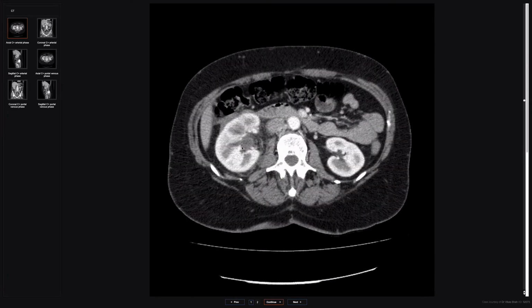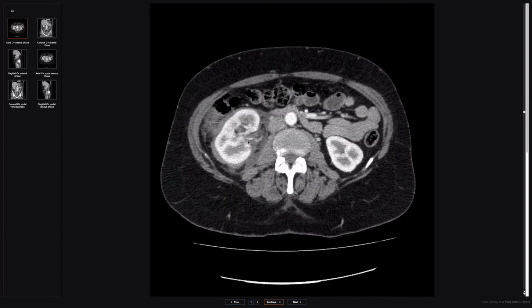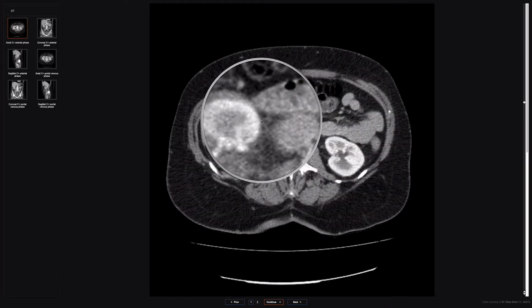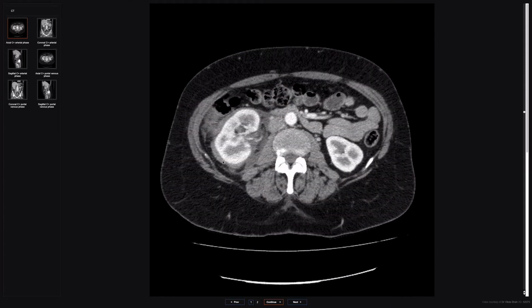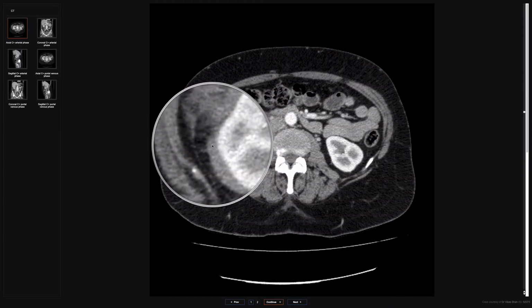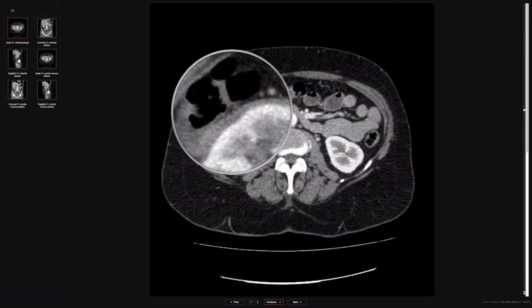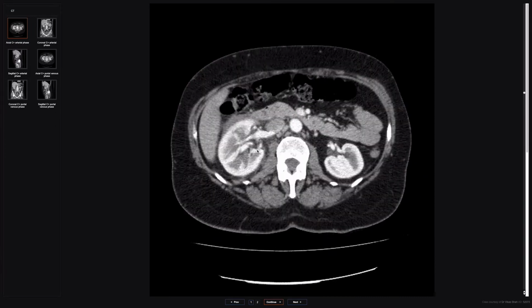We've got fluid and high density distending the renal pelvis and the pelvicalyceal structures here in the hilum of the kidney. We've got fat stranding all the way around the kidney, like a rim of fat stranding, but also this high density, which is more than fat stranding. So that could be blood encasing and enveloping the right kidney. This is all on the arterial phase study.